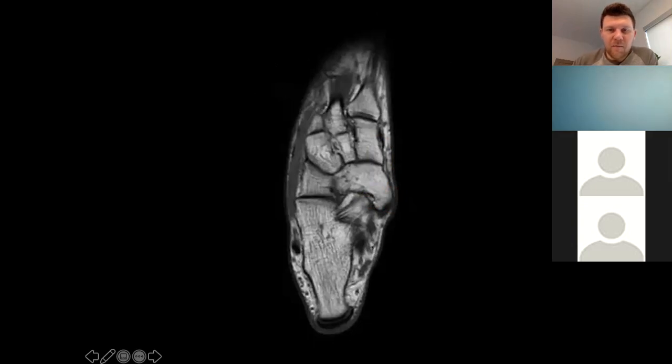So we're going to start off by, what bone is that? Calcaneus. Okay. We're going to keep going down the line. What's there? Cuboid. Okay. What's that one? Navicular. What do you think is right there underneath the structure? What bone is that? Is that the sustentaculum? So sustentaculum is medial.